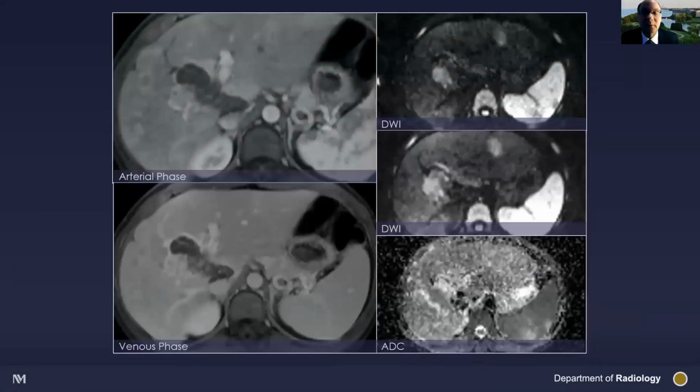How about this patient? Well, this illustrates why sometimes these cases are really hard to assess. Here you have the arterial phase, here you have the venous phase. You can see that there's areas where it's no longer enhancing, but notice when you add diffusion in the mix, you can see that this subtle area of enhancement, it didn't necessarily wash out, but it's clearly restricting diffusion, making you confident that it's most likely residual or recurrent tumor, probably from a different blood supply.